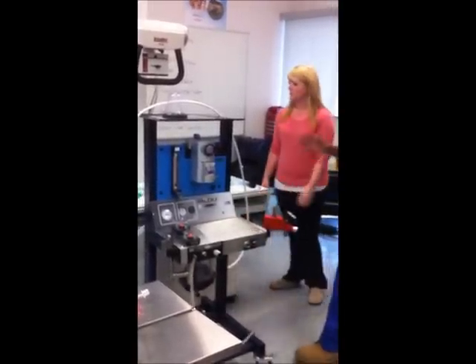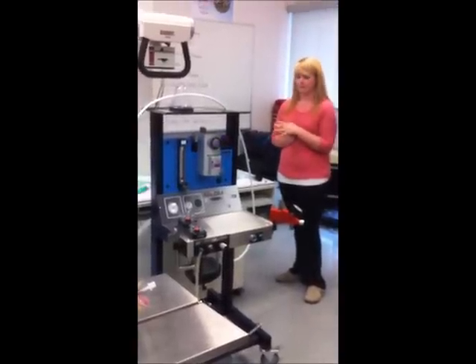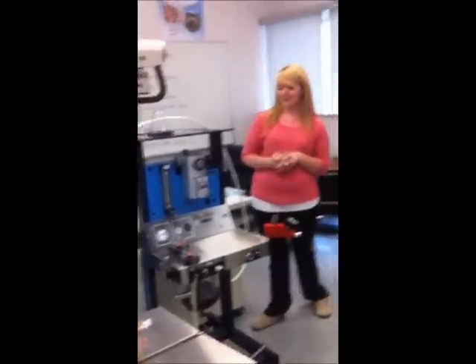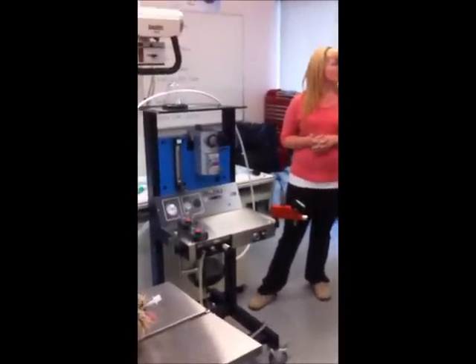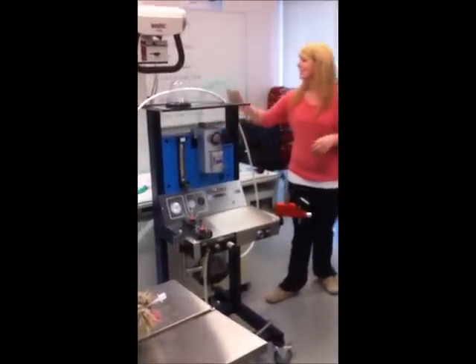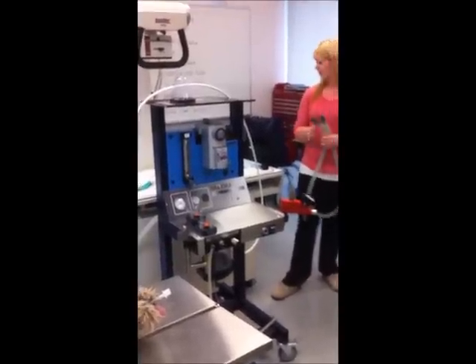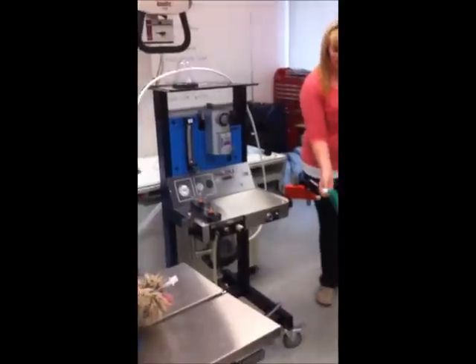Nikki's going to succeed in setting up the non-rebreathing system. And again, you guys are helping her. Let's go. And of course she has Cassandra making excellent notes for her. Let's go, Nikki. I don't remember any of this. And that is why you guys are here. Teamwork, only together, people. Just not on the day of your assessment.